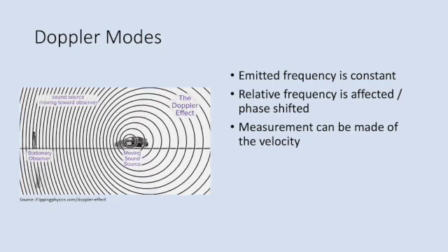All right, let's review what the Doppler effect is. So remind yourself that the frequency of sound that we emit from an ultrasound transducer is constant. However, we know that tissue inside the body is often not constant. Our blood cells are moving, our heart is beating inside our chest, our lung is sliding.